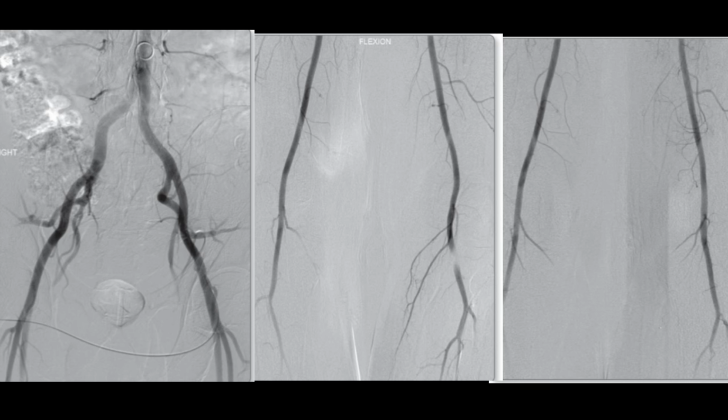Today, I'm examining a series of selected images from a catheter angiogram of the lower limbs. The angiogram highlights the arterial system from the distal aorta to the upper calf. The catheter was inserted via the left common femoral artery, allowing us to get a detailed view of the vessels. In these images, I'm noticing an abnormality in the left popliteal artery.